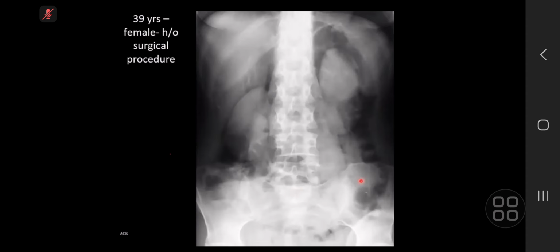Okay, if you see here, let me take over. Now, this is a very good film to develop your eyes on where retroperitoneum can be. So, of course, it is outlining the kidney, outlining the psoas, right? But other things you have to remember is, this is the hemidiaphragm. The posteromedial portion of the diaphragm is touching the retroperitoneum.